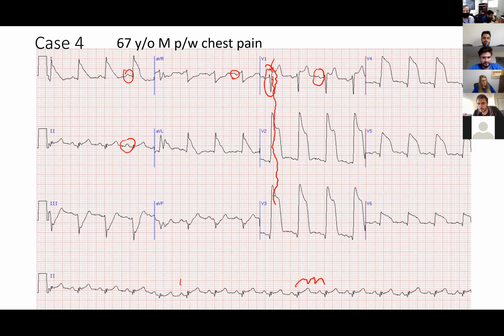You can see that the QRS is ending in a normal QRS duration, but then your J point is happening very elevated in these leads from V1 to V6. Since then, you have an ST segment, which in some is straight, some sloping, and some down sloping, but the degree of elevation is quite a lot.